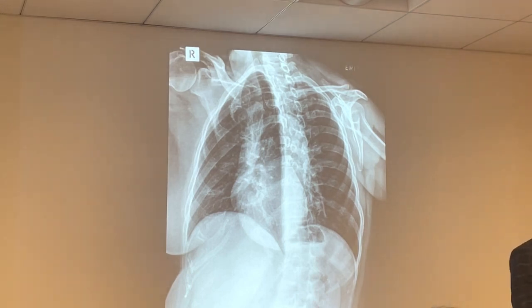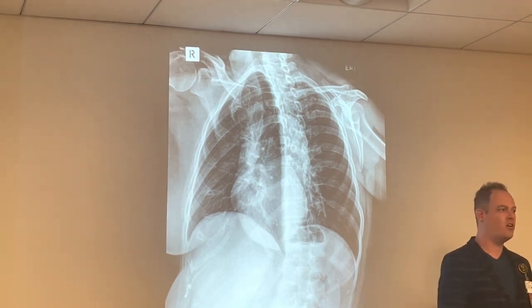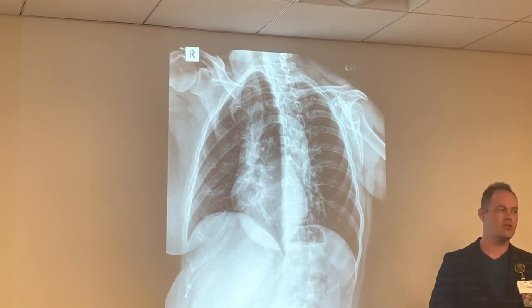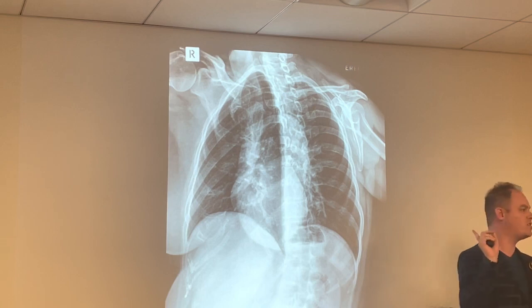Remember, think correctly for a second. Remember what I said. On oblique ribs, you always mark the side touching the IR. Now we know between obliques, there are different sides touching versus what is elongated. Posterior obliques are elongating the side down. Anterior obliques are elongating the side that is up. Based on that principle, what is marked, what's elongated?